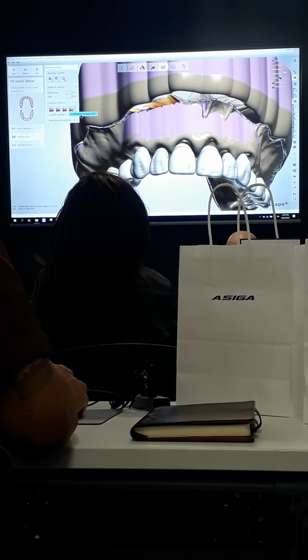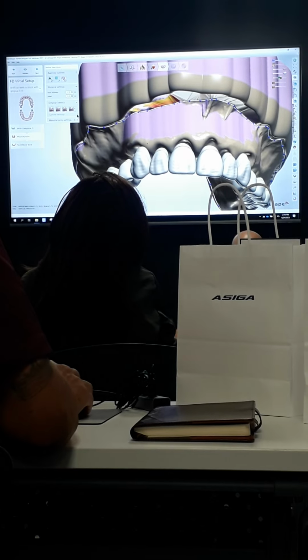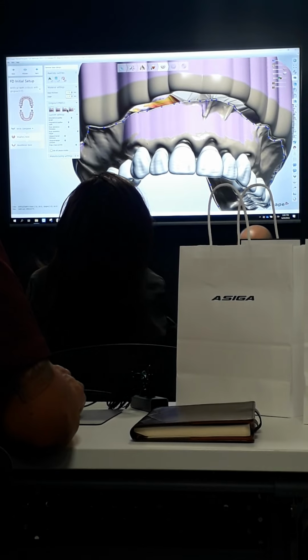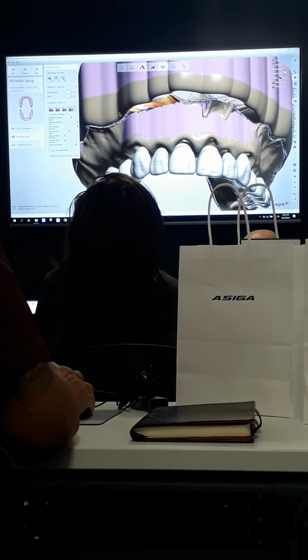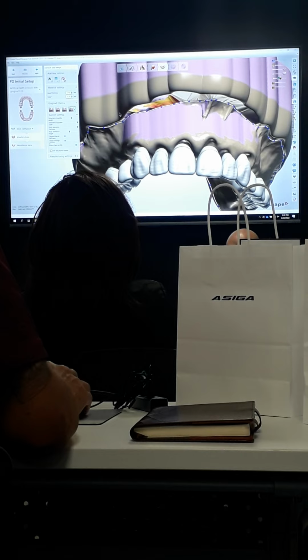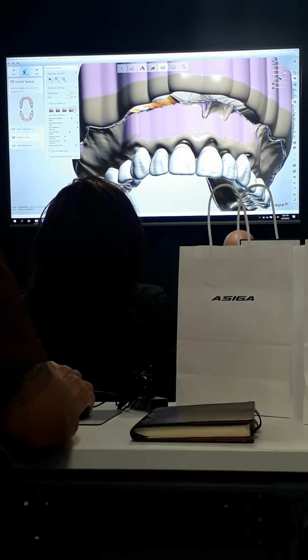And this is a new feature with 2021. So if you're on 2020, you wouldn't see this. I can choose one, and then if I drop down the custom settings here, I can see the default slider positions. As I click through the different ones, I can see what the differences are, where the sliders are. I can even see my custom one that I created. So for instance, maybe I liked the intense, but I didn't like how tall the root eminence was. Maybe it was just too tall for me. So I created my own, adjusted that slider, and then I'll use that.